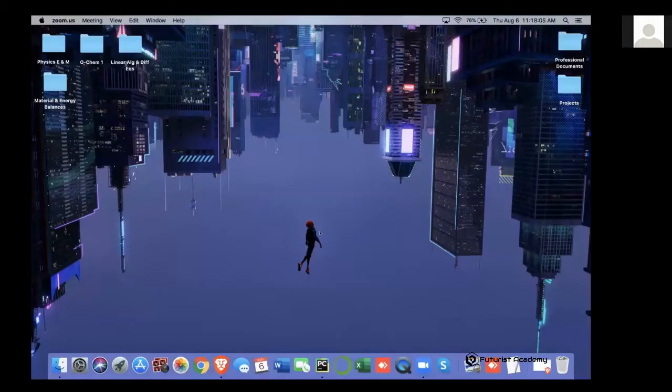My demo today will be about a scanner that displays whether or not a given user MRI scan has a tumor or not. So essentially what I did, can everyone see my screen?